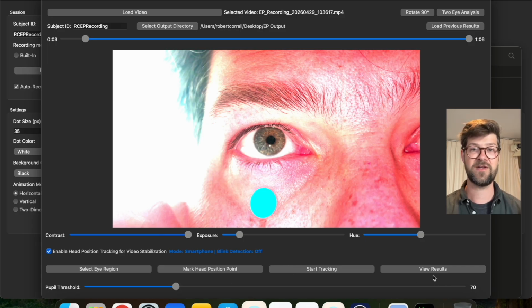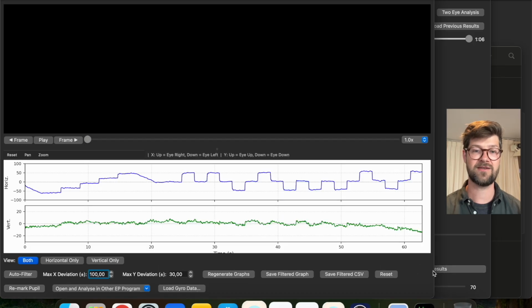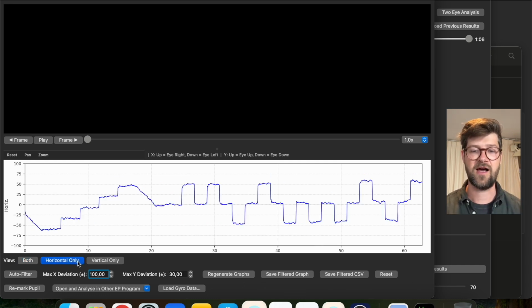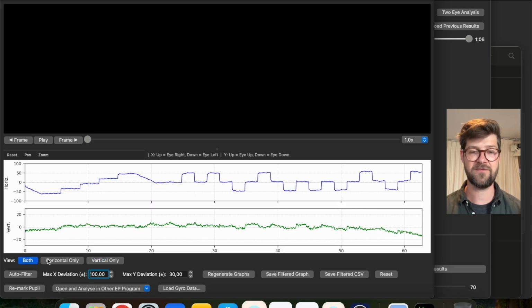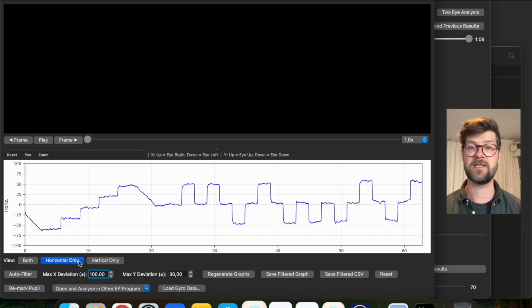And then once it's finished processing, you can click on View Results, and we go into this Results view. Again, there's another whole video about this available on my YouTube and on the website. Just quickly go through this specific example. Because we're doing a VNG style test with horizontal saccades, I don't really need to look at the vertical graph, it doesn't really tell us anything, so we tend to go for the horizontal only graph for this. The horizontal graph is then the blue line there, and when it goes up, that means that the eye is moving to the right. When it goes down, that means that the eye is moving to the left.